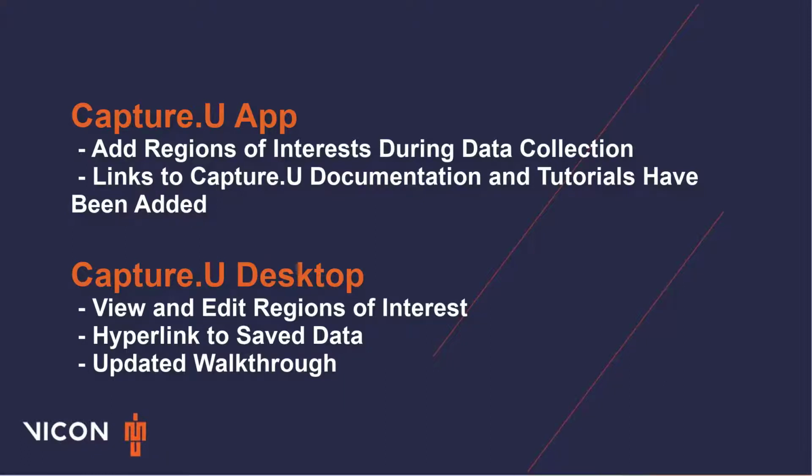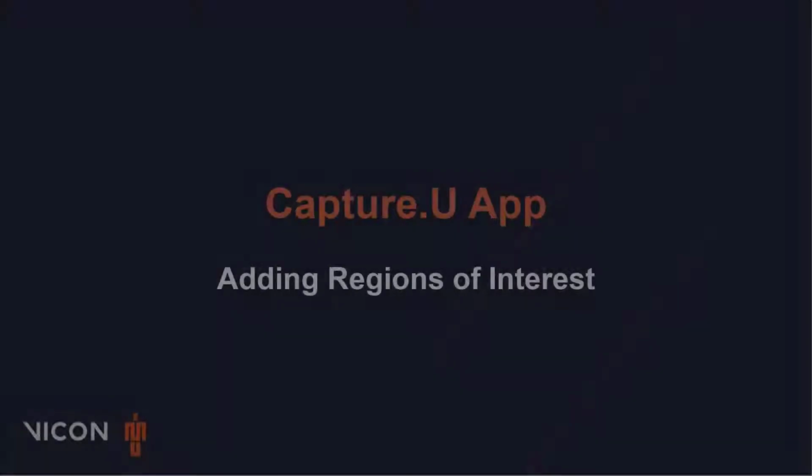The new features in Capture.U desktop include the ability to add and edit regions of interest, the ability to export data by region of interest, a hyperlink will be displayed to the location of the downloaded data, and the Capture.U desktop walkthrough has been updated to include the regions of interest.